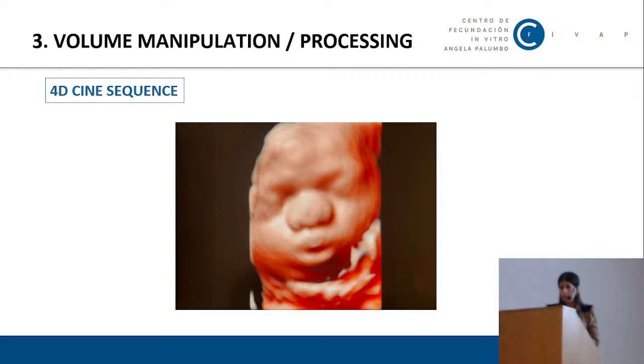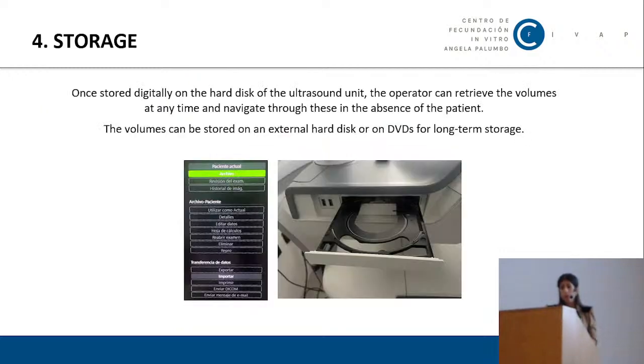And finally, the storage. Once stored digitally on the hard disk of the ultrasound unit, the operator can retrieve the volumes at any time and navigate through them in the absence of the patient. So after the patient leaves the room, we can take the volumes, start playing with them, choosing filters, modifying, and the volumes can be stored on an external hard disk or DVDs for long-term usage.